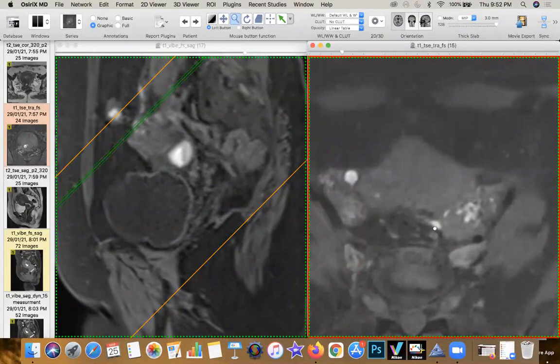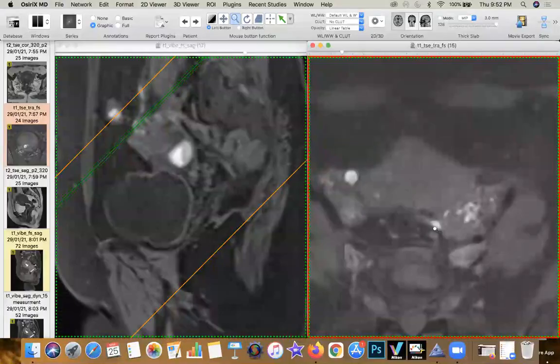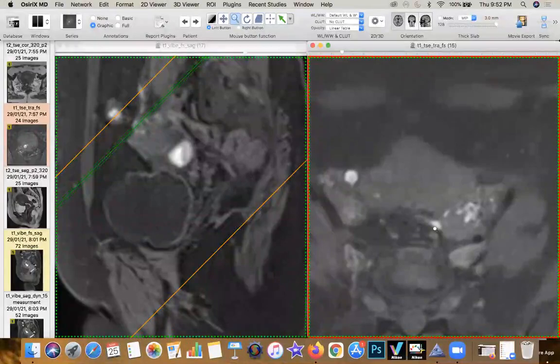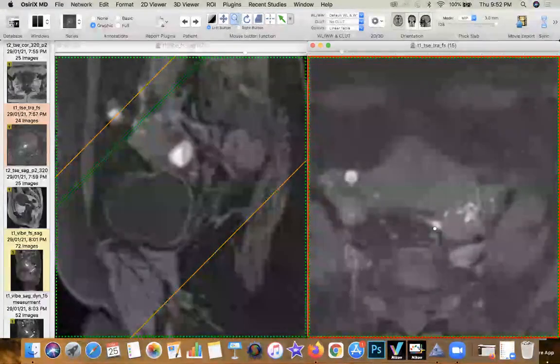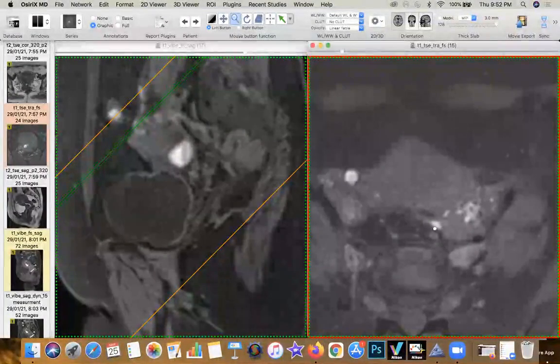endometriotic tract formation. So please remember, whenever myometrial surgery is done, surgical tracts are created. If the endometrial cavity or the endometrial lining is disrupted, you need to be very careful in follow-up to make sure that none of these surgical tracts are lined by endometriotic tissue, because in the future that patient is going to become a case of peritoneal dissemination of endometriotic tissue, which is iatrogenic in nature.